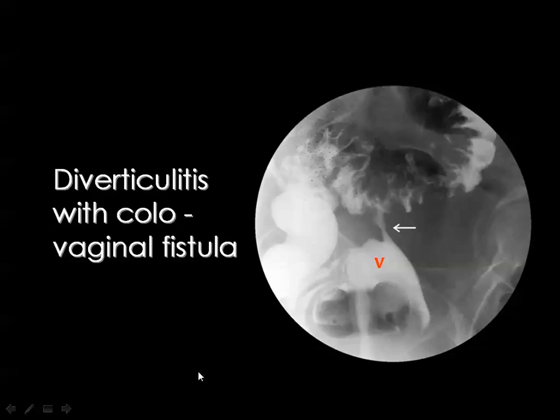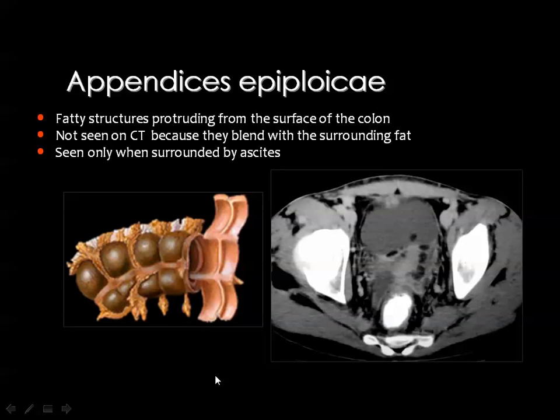One of the common findings usually presented in exams is a patient with colonic diverticulosis and air inside the urinary bladder. Then you know that this air is coming from the colon as a sequela of a vesicocolonic fistula, and this is usually the diagnosis.